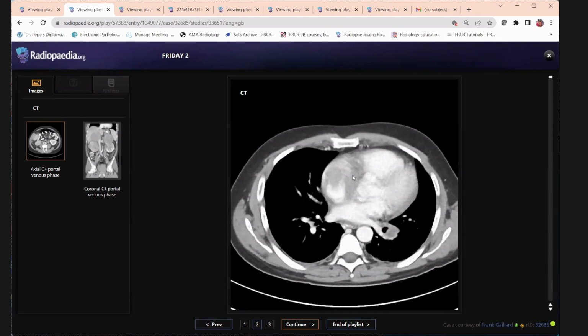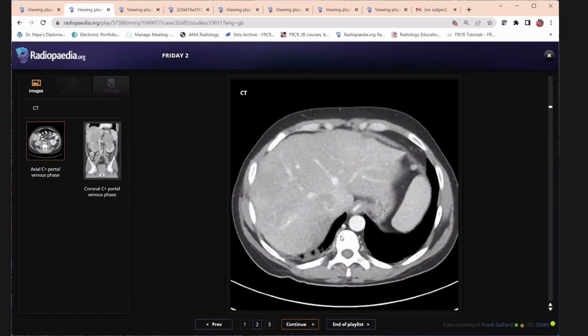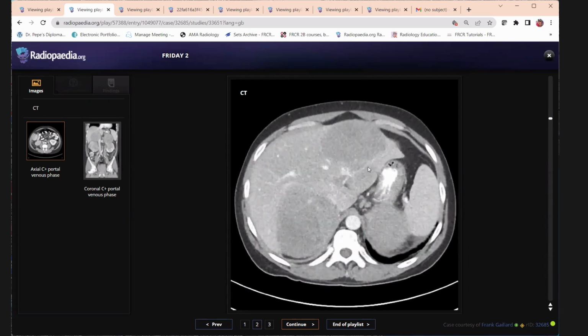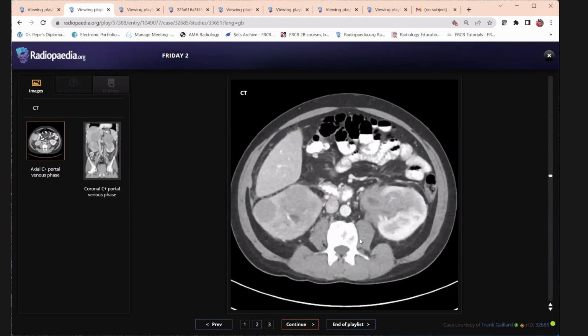There was a thrombus here. And the other differential you can also say is a Kaposi sarcoma. Okay? Because in immunocompromised patients, Kaposi sarcoma is more common than lymphoma. But this was a Burkitt's lymphoma, though you were right in calling it a lymphoproliferative disorder. That was good.